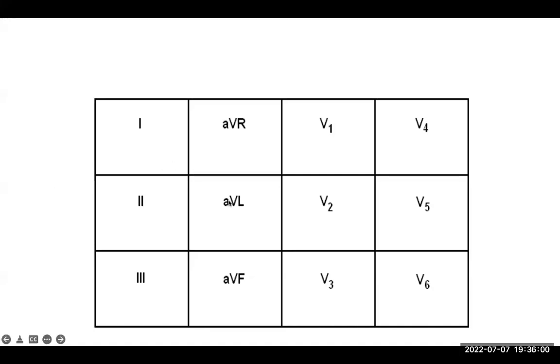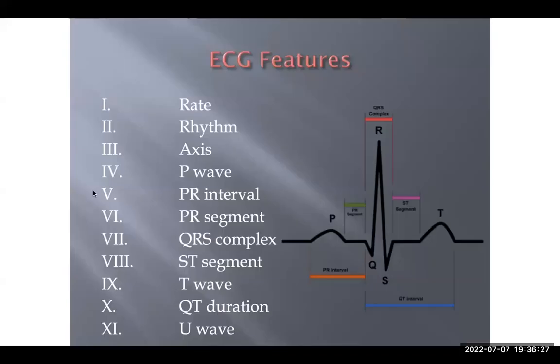So whenever you open the ECG, this is how it's laid out. And as we'll see in the ischemia and infarction slides, each of these leads represents a certain area of the heart. For example, V1 and V2 are called contiguous leads because they look at one part of the heart. V3, V4 the same, V5, V6 the same, 2, 3, and AVF the same. We'll see this in the subsequent slides. This is just an introduction to and a reminder of basically the anatomy of the ECG.